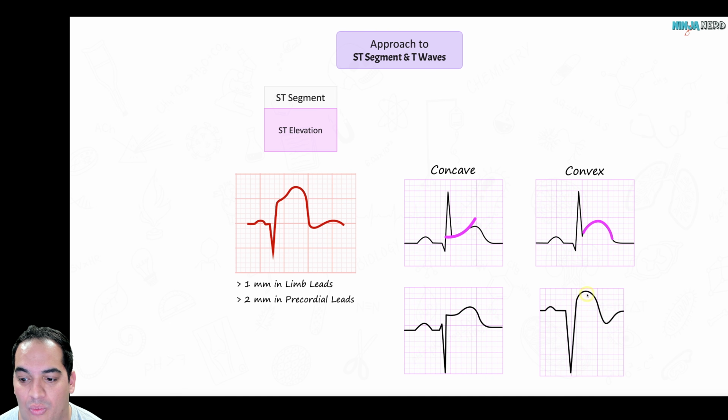Here's just another way, what we call the tombstone effect. This is very concerning for myocardial infarction. So not just elevation and contiguous leads, but also configuration helps me to identify if there is a concern of STEMI, right? And then don't forget to check your troponins, because if I have an ST elevation and a troponin elevation, it may make me think about a STEMI.